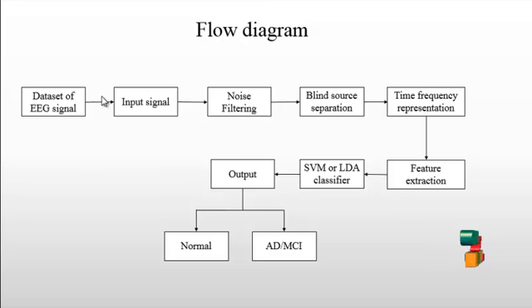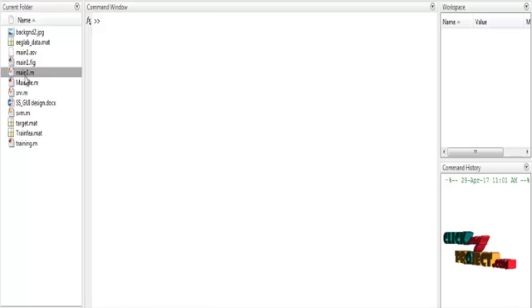And then feature extraction. To calculate the feature extraction, we compute the mean and standard deviation, and particularly the analysis of the process, and we also calculate the entropy value. So this is the overall flow diagram of the process. Let us discuss the running procedure for the project.